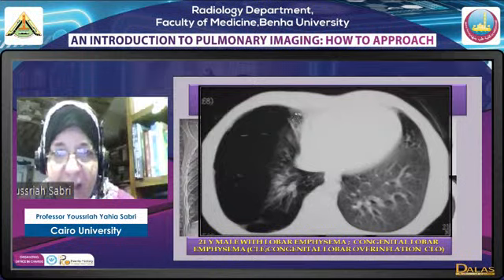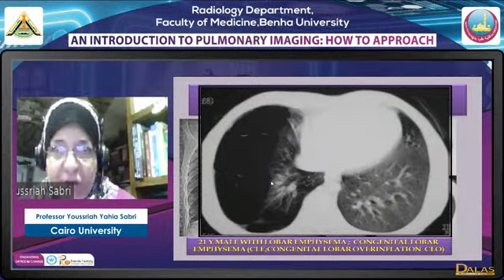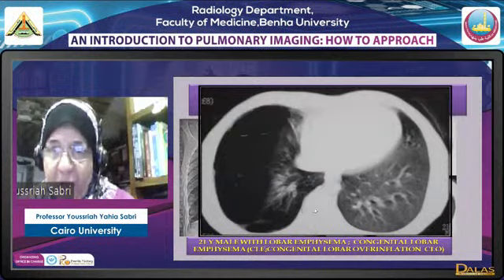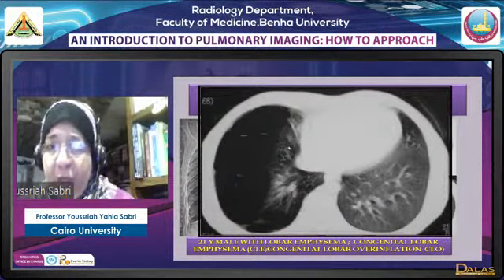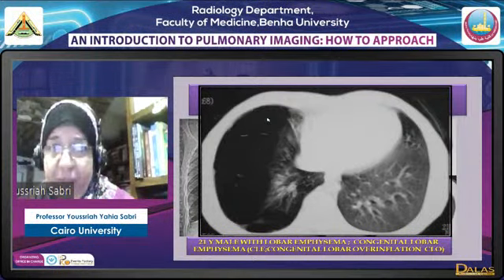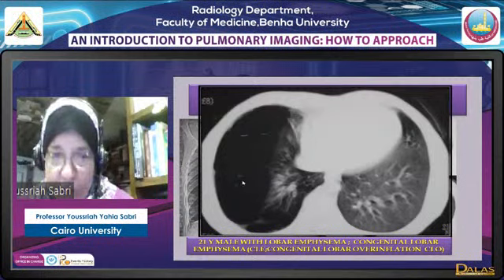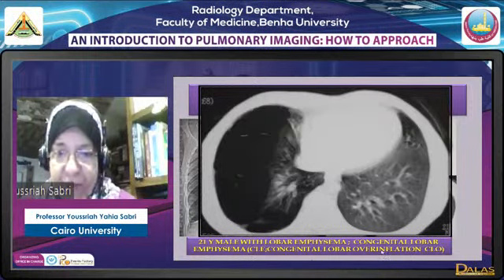The lung opacity is demarcated by a line. A demarcation by a line means this is a fissure. The lung beside the heart is a middle lobe. The lung beside the spine is a lower lobe. They are both delineated by fissures, so we have a middle lobe and lower lobe collapse. This means that all that we see here is a hyperinflated upper lobe. This was a 21-year-old patient with lobar emphysema. This is congenital lobar emphysema.